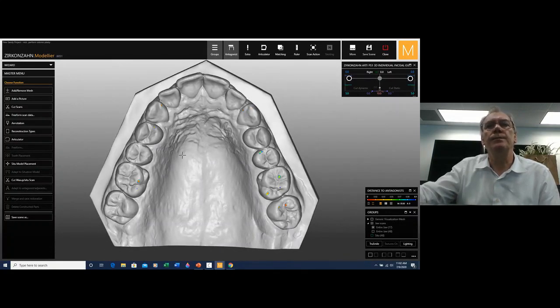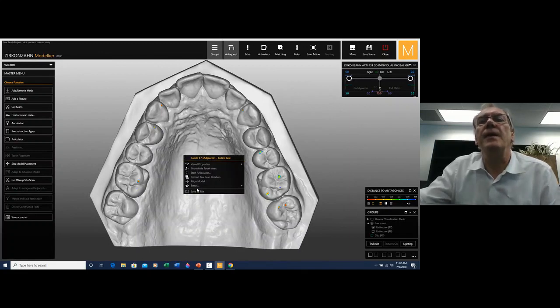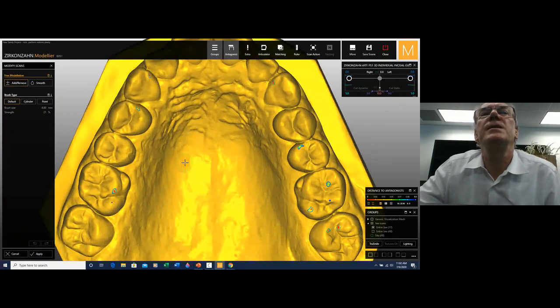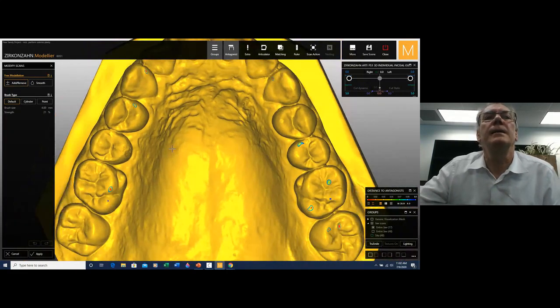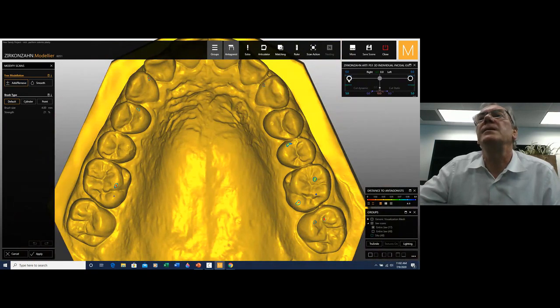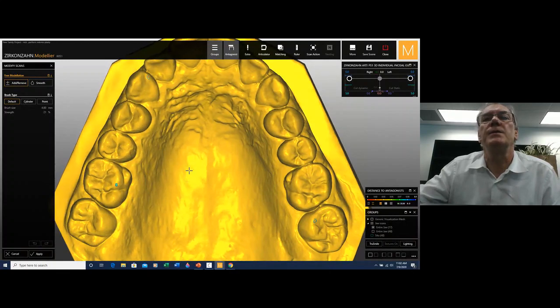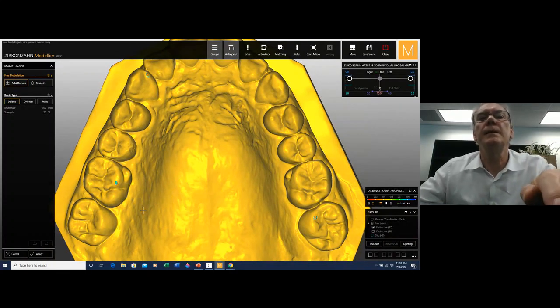Okay, now I have faith in the data that I've received, so I'm going to perform a little bit of odontoplasty so I can eliminate this contact and see what happens and if it is steady. So this is the first one I'm going to eliminate. I'm going to make my brush a little small.